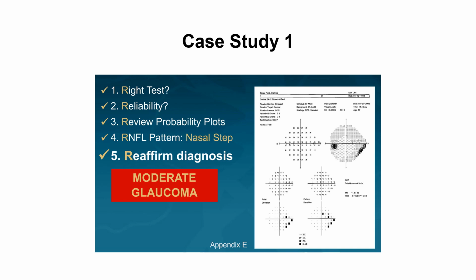And you can look for the other parameters we mentioned here: the glaucoma hemifield test outside normal limits, the mean deviation, and the pattern standard deviation. Please, if you watch this YouTube lecture, you will see an explanation of every point in this printout.